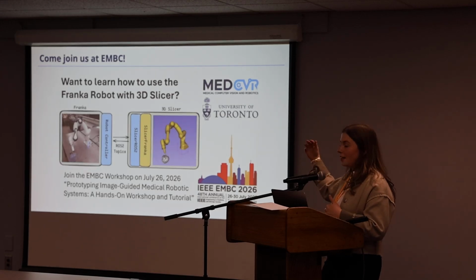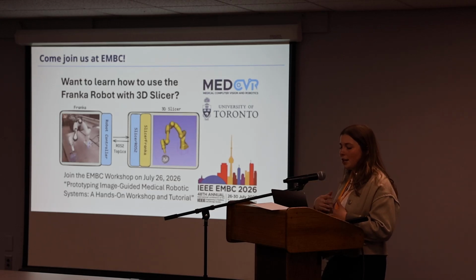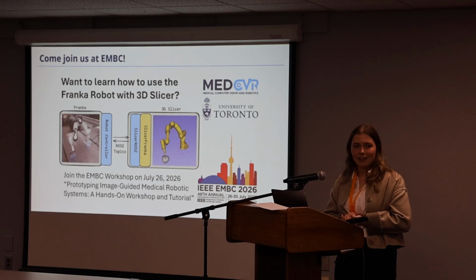But yeah, here you can see they don't have the goal state robot preview. This was built on a previous version, so we're working with them now to see how we can merge the two, the trajectory preview and some of these cool trajectory generators. Yeah, I think that was all that we have for the workshop.